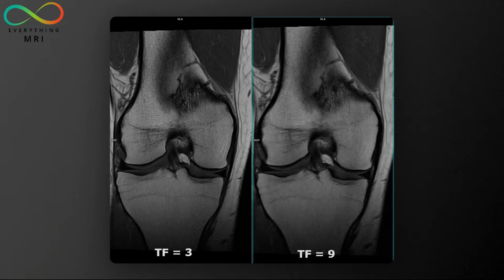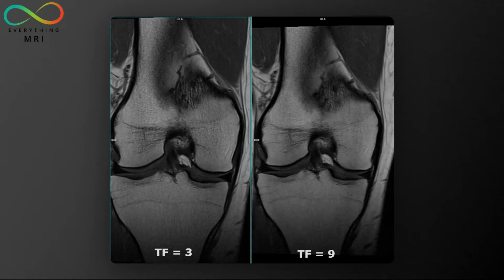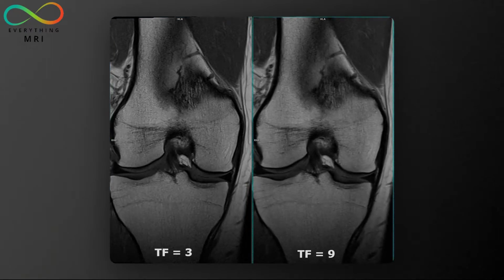If we zoom a little bit closer, in fact, it can give us a little bit the perception that some details are less clear, maybe in the image on the right, and this is particular because blurring starts to be pretty pronounced here. Now let's try to repeat the same process with a proton density sequence instead.